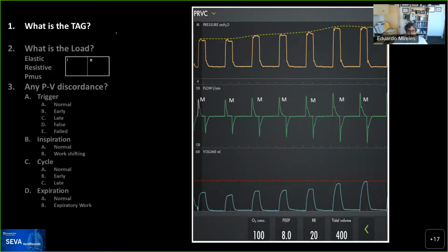And this is a common error because people see that you set the tidal volume, and the behavior is to say, "Ooh, this is volume control," but no, the 400 here is the target. And then the breath sequence, in this case, all of them are mandatory. Even though the first breath is patient triggered, all of them are being cycled by the ventilator. You can see that all the breaths have the same I time. So this is a CMV.